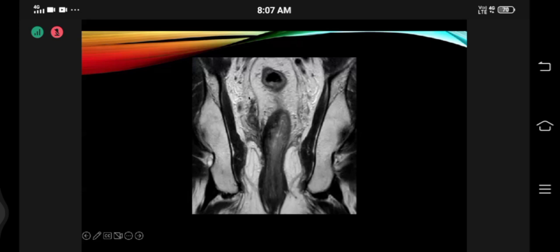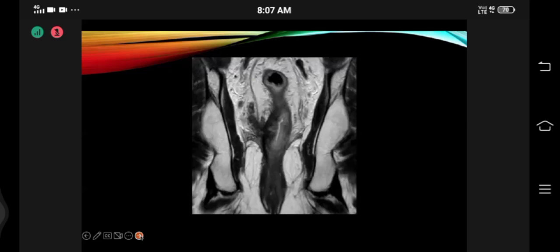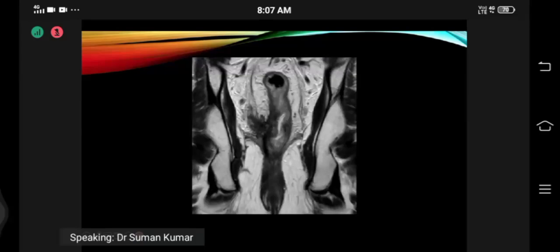I mean, I am not a surgeon, but this is what my surgeon says. We are going beyond TME. So the plane of surgery would be extralevator APE. So here the sphincters will be removed, but the levator also is involved, so ELAPE is the surgery. So this is a tumor which is extending beyond the mesorectal fascia. So there is no way you will get a plane through the TME, the mesorectal fascia excision. So the plane of surgery will extend beyond the TME. So this is a tumor, and this is most probably an EMVI which is involving the mesorectal fascia.